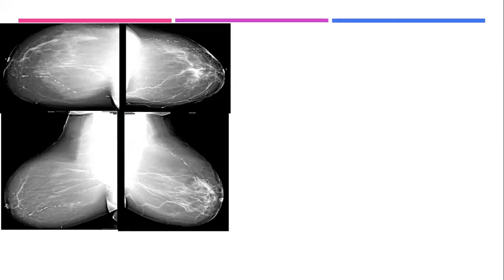Okay. This lady, she's an elderly lady, who had open heart surgery, after which she developed an ulcer in her left breast.